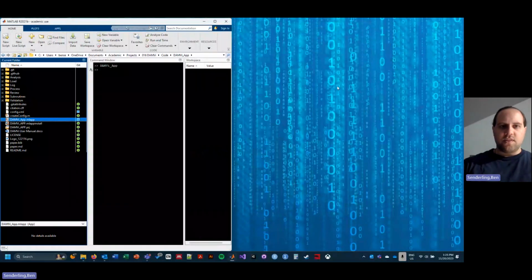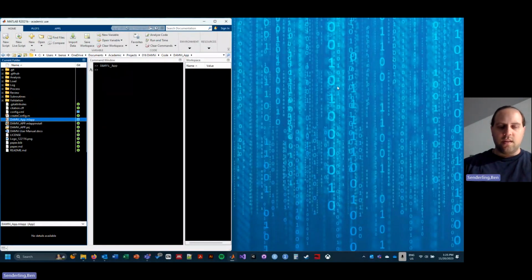Hello, my name's Ben Senderling, and I wanted to start making these videos to show how to use this app I've been working on. It's called the Data Acquisition Management and Visualization app, so DAMVi, and I've been developing it over the last couple of years to help manage data, compile it, that's a big part of it, but then also process data. So for this video, I'm just going to be showing how to load and compile Actigraph data.